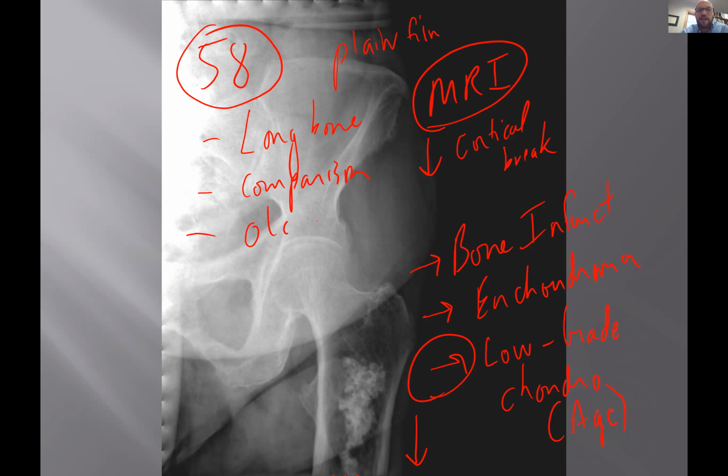So before I start pulling MRIs and having some radiologist who's not good at bone and joint call this a chondrosarcoma or a MET or an osteosarcoma, and get everybody chasing it and chopping stuff off and cutting stuff open, I might say, hey, I'm a chiro. I'm conservative. I'm going to start with plain film. Let's see how big this is. There's no pain there. That's really helpful. It shouldn't be aggressive. There's no pain. And let's get old films.